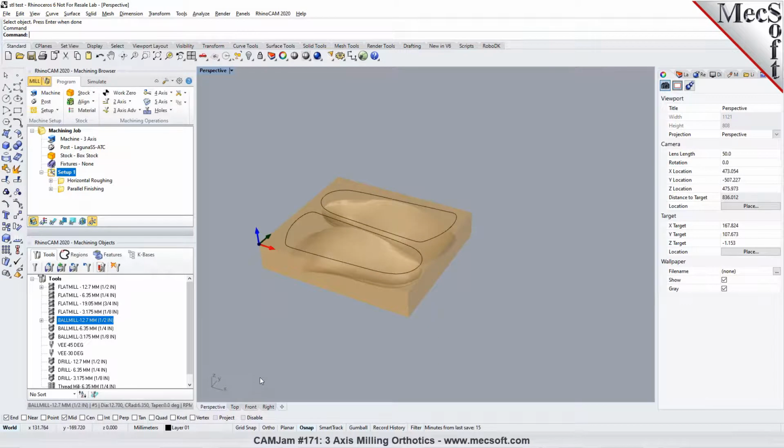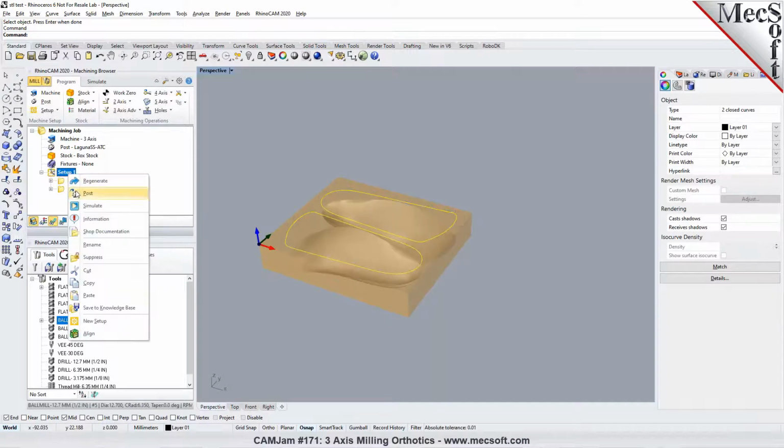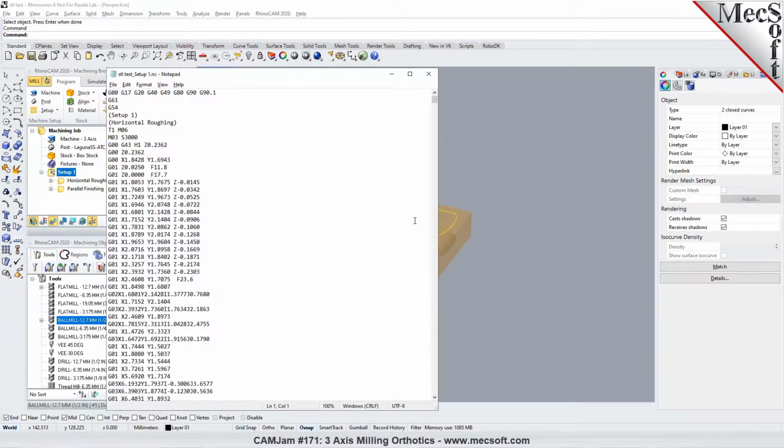Now, at no point do we have to worry about any type of G coding, correct? Yeah. Once you generate a toolpath, this is what we call toolpath generation. Once the toolpath is generated, you do what's called post-processing. Post-processing is the step which converts the toolpath to a G code that will be compatible with your machine tool.